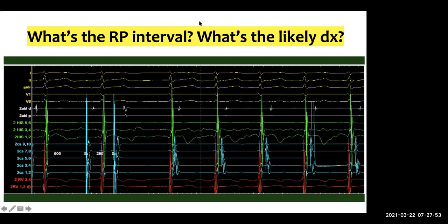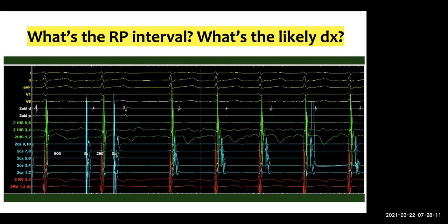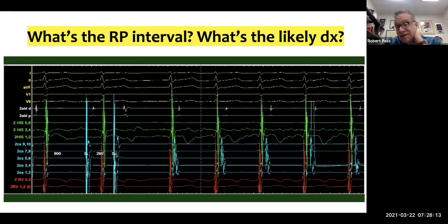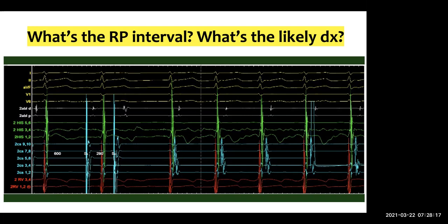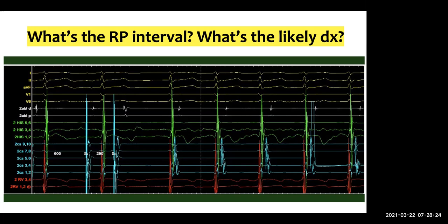So let's see. In tachycardia beats, in the coronary sinus, I would say that the proximal seems to be the earliest. I agree with you 100%. What does that tell you? So it's like a concentric pathway. That's right. It's a concentric pattern, right? And we don't really have a very good A in the His, unfortunately. Right, to see where, yeah.